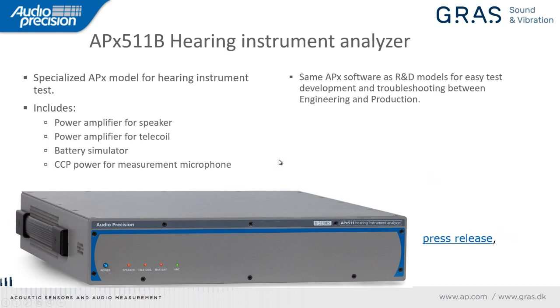Now, this uses the same APX software as our audio analyzers, used for R&D. And this allows for easy test development and troubleshooting between engineering and production. It has fast measurements, high performance, and very flexible software.